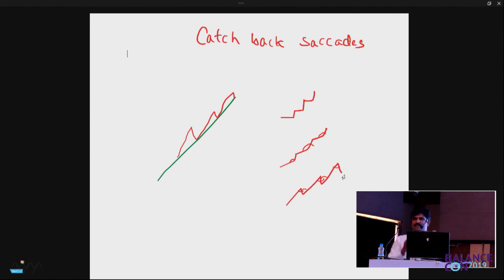We went into the specifics of saccades. We knew how a step pattern represents a hypometric saccade, how an oscillation represents a hypermetric saccade. We also saw how a glissade represents the eye not knowing how far to fire. If it overfires, it goes beyond a particular point, then it comes back as a glissade, or it underfires, then it reaches the point as another slow movement. That is two kinds of glissades we saw. Then we came back to the slow phase.